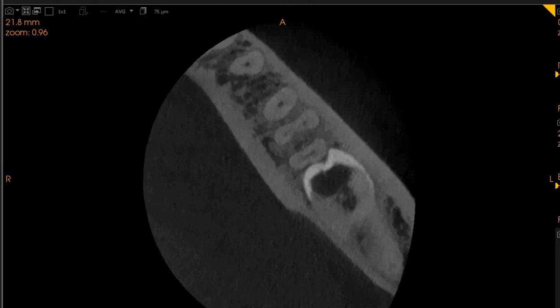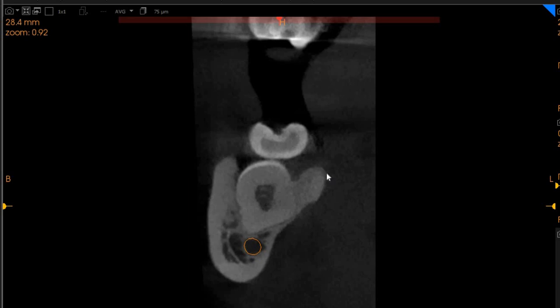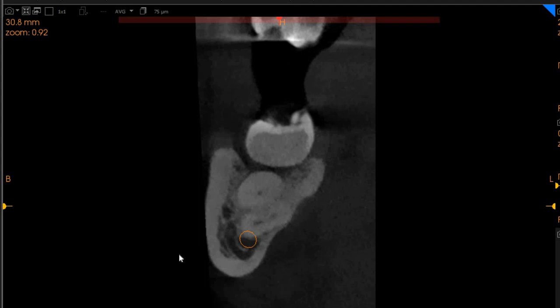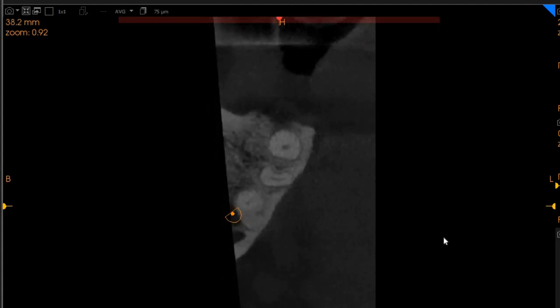Just to give you another idea, the 7 is also very closely associated. So I'm going to take you to the 7 now. So this is the 7 grossly carious, the 8 is over the 7. This is the chamber space impacting into the bone, compressing the nerves. You can very clearly see here the kidney bean shape is also the nerve being compressed by the lower left 7. Even extracting this tooth is going to be significantly difficult, and doing a root canal in this tooth is also going to be very significantly difficult.